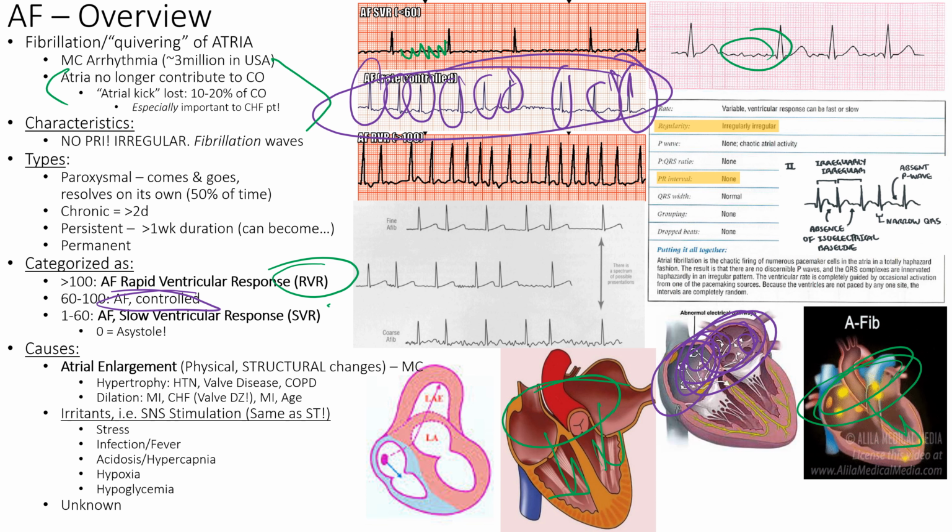Again, they have quivering, shaking atria, not ventricles. That's ventricular fibrillation. We're talking about atrial fibrillation, right? The atria are fibrillating, and therefore we don't get a nice P wave, right? We get a P wave from many, many different areas, and they're not organized in any kind of fashion. It's like how we decided on groups earlier, right? That is a fibrillation event, right?